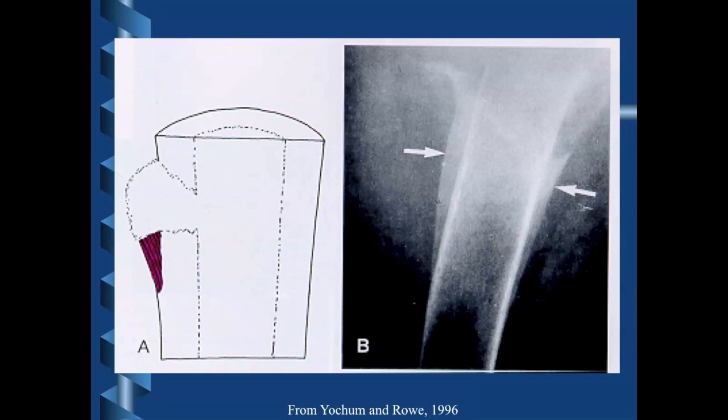And this isn't particularly pleasant to think about, but if you like, think of it in terms of the sock just getting full of infected material or pus, so it's getting pushed away from the actual cortical bone, whereas down here the periosteum is still attached to the cortex of the bone.